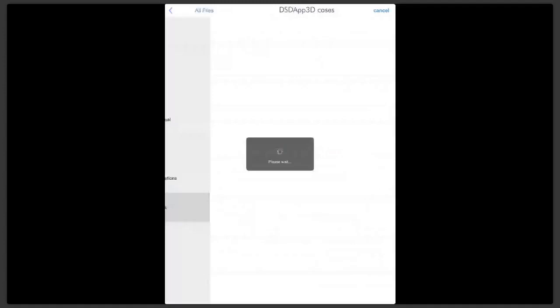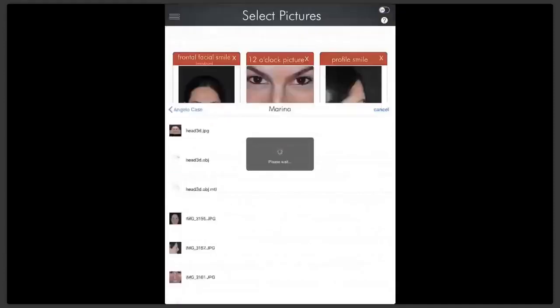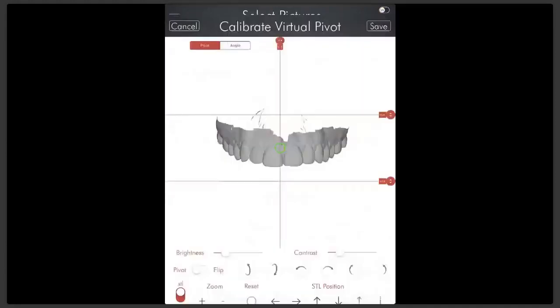As I said, we're not going to do it with the facial scan this time. We're going to start with a simpler way, and later on we're going to have another webinar showing how to do the calibration with the facial scan. It is not hard to do, right? It's just that, time-wise for our training, we're going to do a simpler one.